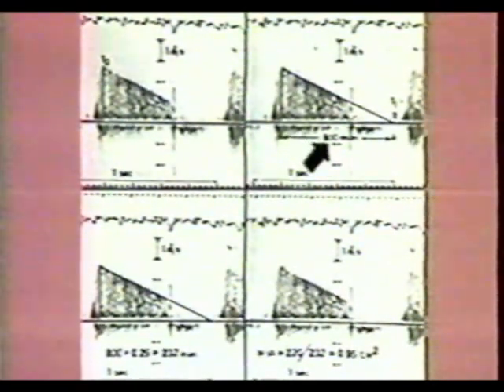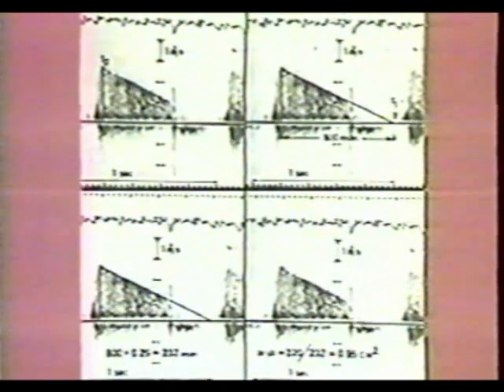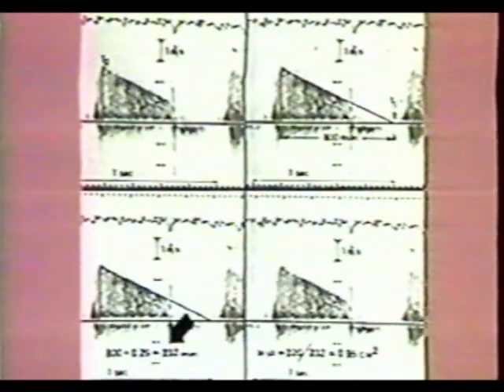The time interval between this point and our original perpendicular is the deceleration time, which in this case is 800 milliseconds. The deceleration time of 800 milliseconds is multiplied by the constant 0.29 to yield the pressure half-time, 232 milliseconds.